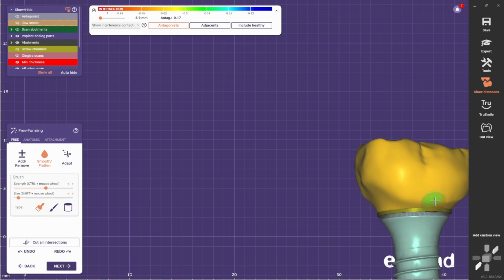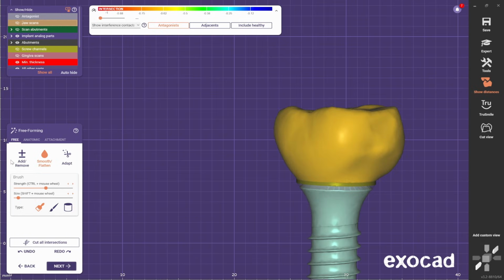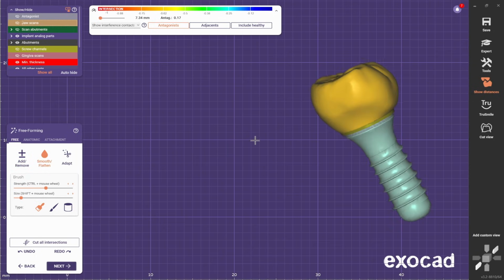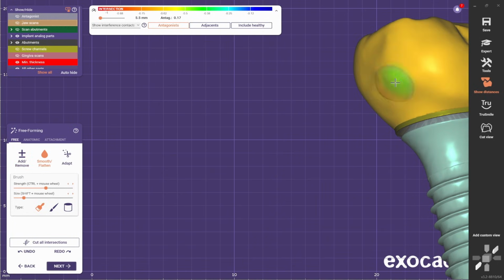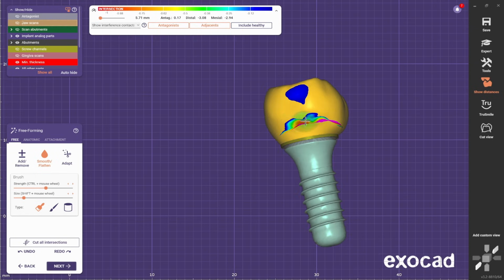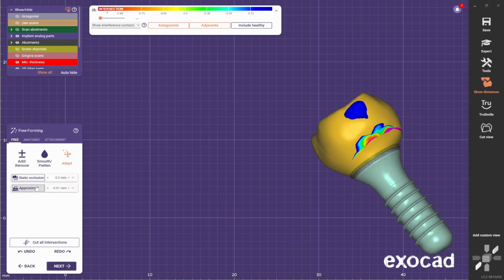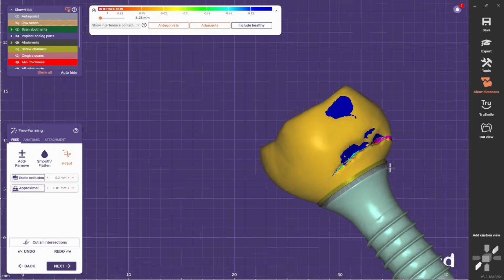Now I smooth the line that I defined there, but now imagine that I want to add a bit here, and I add a bit there, and I smooth this, and I want to readjust in the end, but I want to maintain the pressure on the tissue that I just defined. What I do is, if you turn on the adjacent teeth, you're gonna gauge where the software thinks that the proximal contact is. So it's gonna show you these ones, and it's gonna show you this.